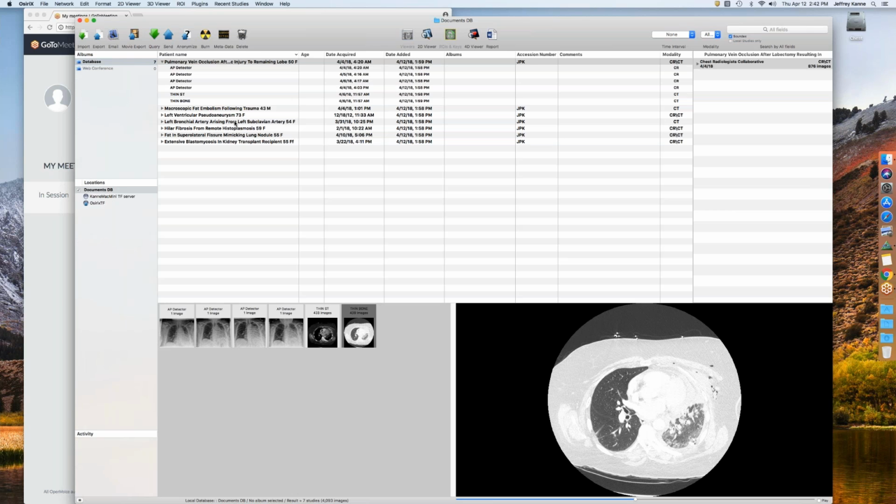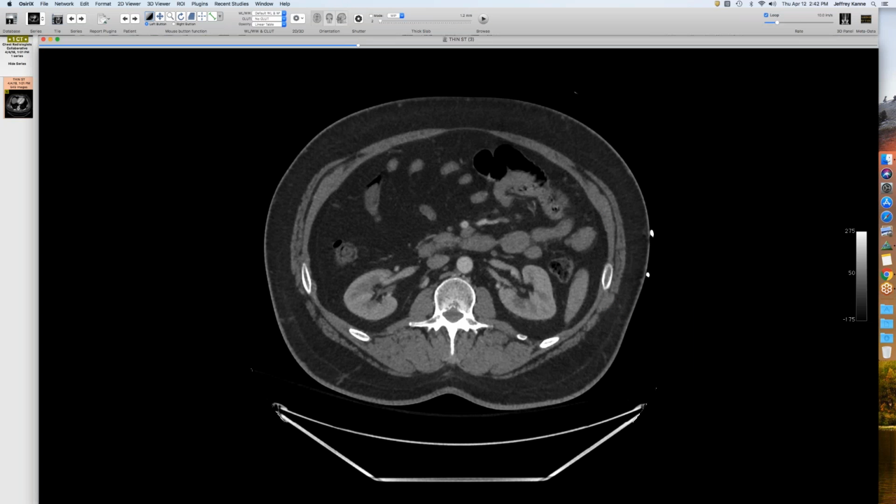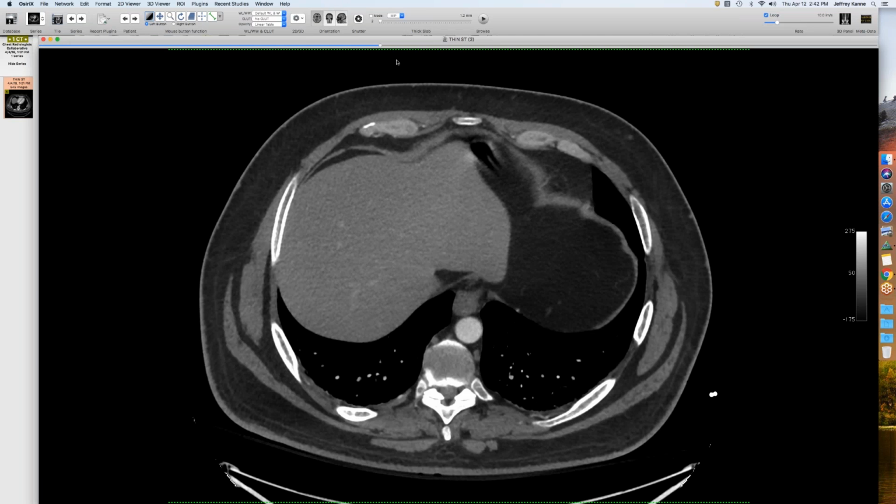Yeah, or in this case, there were some complicated patient factors, a lot of adhesions. When you're doing a VATS, it's a small corner near that hilum, and it can happen. So I think the helpful thing on the CT is to see how puffy those vessels were. Those were really distended. Right. And the vein is just gone. Right. Yeah. This is a crazy case, and I can't wrap my head around it.